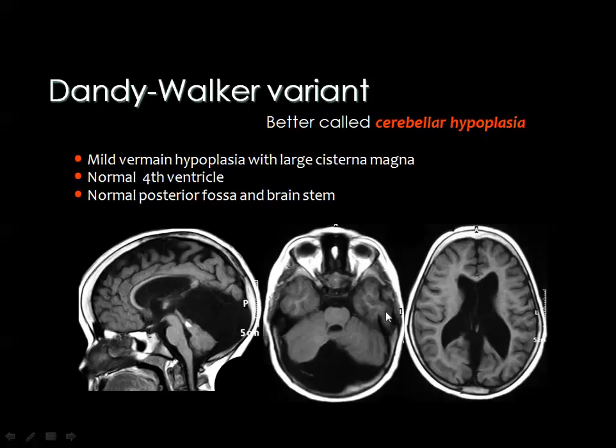In this picture, you see that in this disease, the cerebellar hemispheres are hypoplastic. The vermis is more or less present. It's partially hypoplastic, and there is some communication between the cyst posterior to the cerebellum and the fourth ventricle. But in some sections, you can see that the vermis is present. And hydrocephalus supratentorially is not usually present, but it can be seen in some cases.